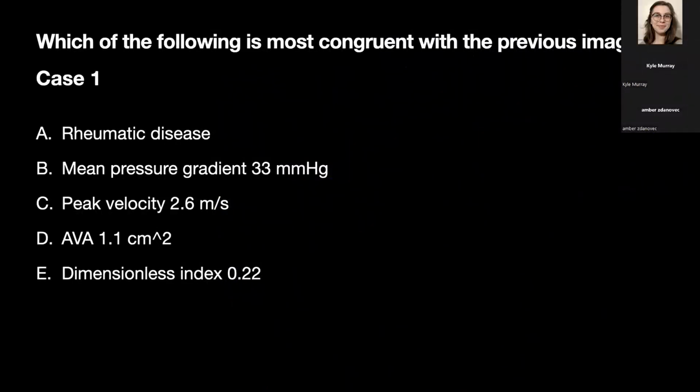All right. So looking at those images, which of the following parameters is probably most congruent with those images? You take all your measurements. Which one are you more likely to get with those pictures, do you think? C. Whoa, okay, we got a C, we got an A, we got an E. Tiebreakers? All right, we got two E's now, so I'm going to say that one wins.